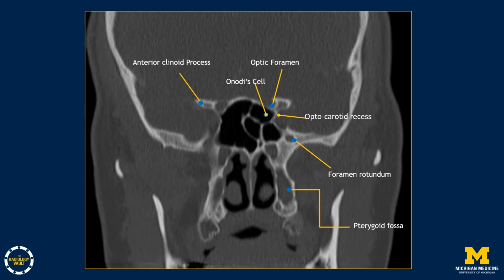Surgeons are acutely aware of the location of the recess, the thickness of the bone, and the intersphenoid septum in the sinuses, all of which are important landmarks. In this section, an important isolated air cell is noted adjacent to the recess, which is termed the Onodi cell.